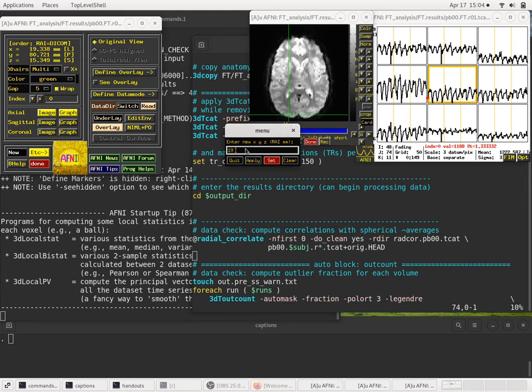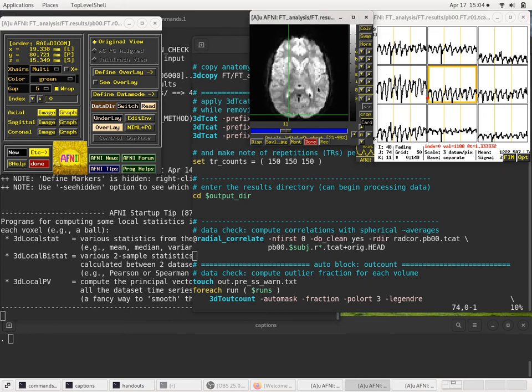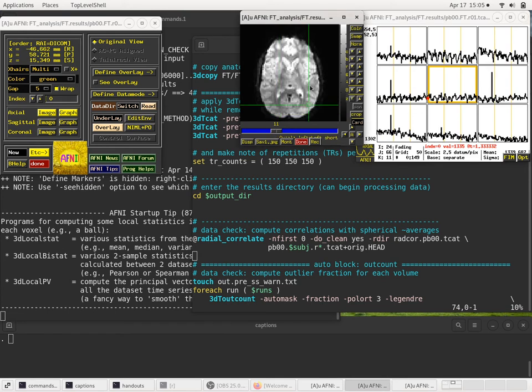So we'll jump to XYZ 19, 81, 15. And I'll hit apply, or I guess I'll hit set. We don't need the window. And did I just move? Jump to XYZ, set. So now we should all be looking at the same thing. In theory, I shouldn't have jumped anywhere because I was already there, but I think I accidentally clicked in the image window or something. So now we're all looking at the same time series, and we've got the coordinates saved so we can jump around.